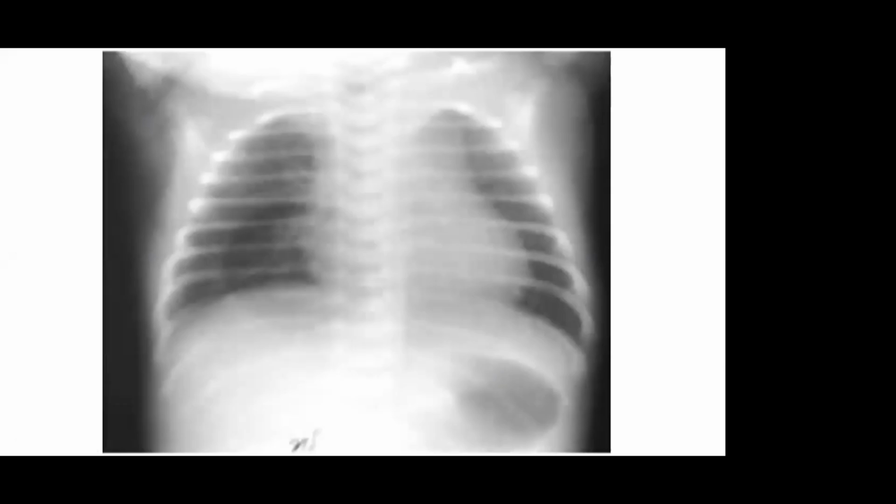Okay, what is this round cavity? Don't try to guess. When you take an X-ray in the incubator, when you do not open the canopy, mind that canopies have this kind of fenestrations. This is not in the new incubator.